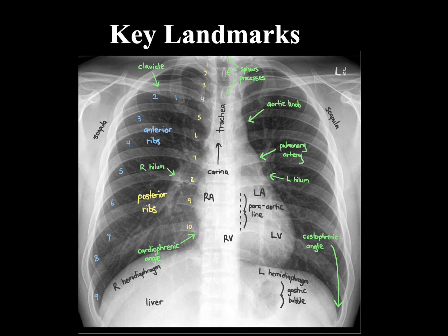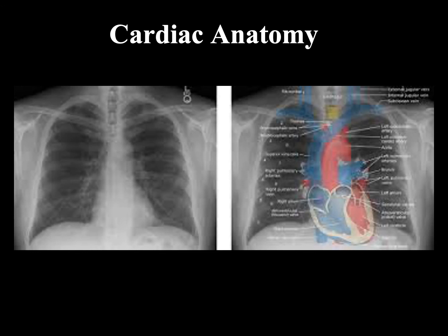You can see a lot of different shadows here, primarily because there's a lot of air in these areas. The right atrium, left ventricle, and right ventricle will be right in here. It's hard to differentiate because of the spine. So just looking at cardiac anatomy, the heart compared to your aorta and pulmonary vessels, is always good to differentiate where these are in relation to the chest cavity.